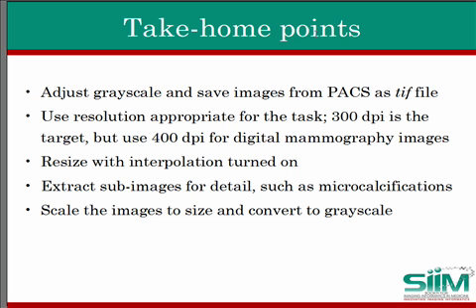The take-home points for this tutorial are to adjust grayscale and save images from PACS as a TIFF file. Use resolution appropriate for the task. As we've said before, 300 dpi is the standard for grayscale images, but I recommend the use of 400 dpi for digital mammography images, particularly when trying to visualize microcalcifications. Make sure that the interpolation is turned on when the image is resized to a larger area. And as we've shown in the mammography example, extracting subimages for detail is important so that they are rendered properly in the output figure. Scale the image to size, convert to grayscale, and then verify using the word processor program.